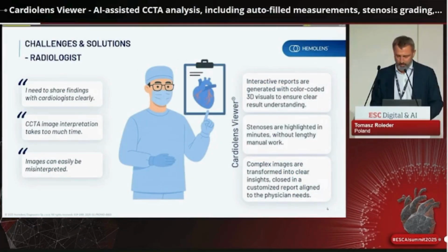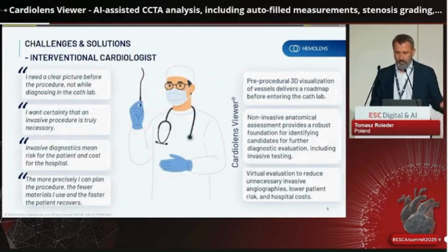We know that in CT scans, we not only see coronary vessels, but other structures which are impossible to analyze accurately by cardiologists, but are done by radiologists. On the other hand, cardiologists use those data to guide intervention, especially interventional cardiologists. They can be prepared for PCIs appropriately. They can decide whether to use an advanced plaque modification system before they have a patient on the table.